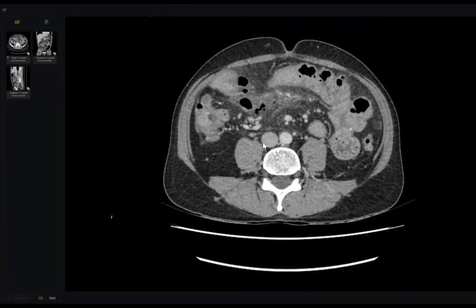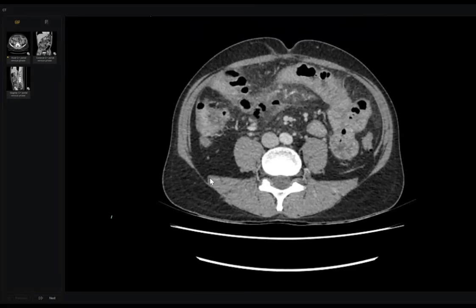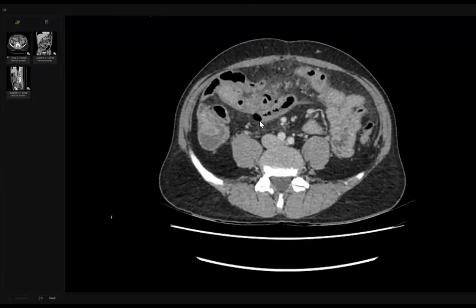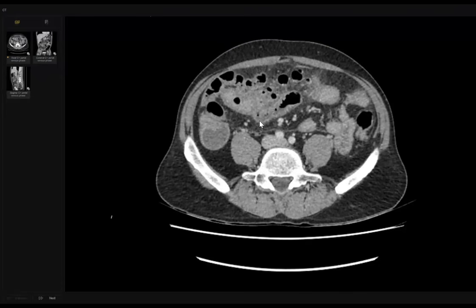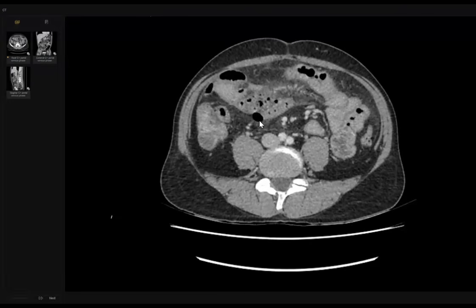Sir, likely these are the jejunal loops. Excellent. And see the air? Yes, multiple foci of air adjacent to it, and these are one of the jejunal loops which got perforated and is markedly thickened. So give me final diagnosis and management, please.